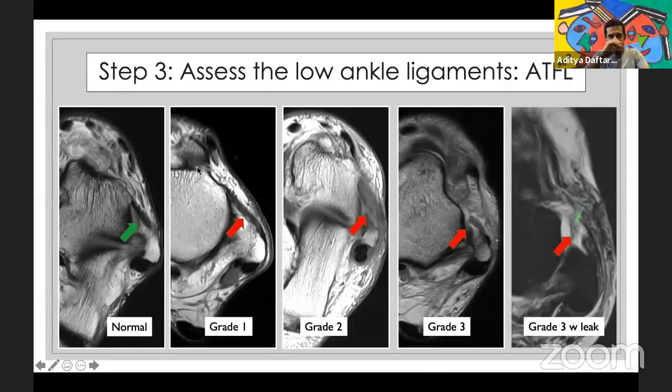I think when we talk about this ankle remodeling, let me just share the screen here. So when we talk about this ligamentous remodeling, really the point is that when the ligament looks very close to a normal ligament, it's a hard call to make.